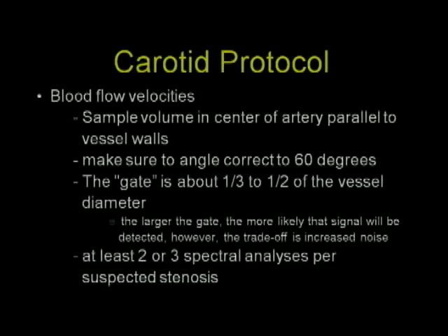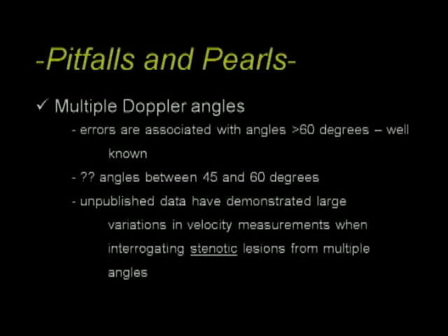Within stenosis, we like to see at least 2 to 3 spectral waveforms within that stenosis, all that fall within the same range of stenosis. There have been some issues in terms of the use of multiple Doppler angles. We insist on a consistent 60-degree angle.